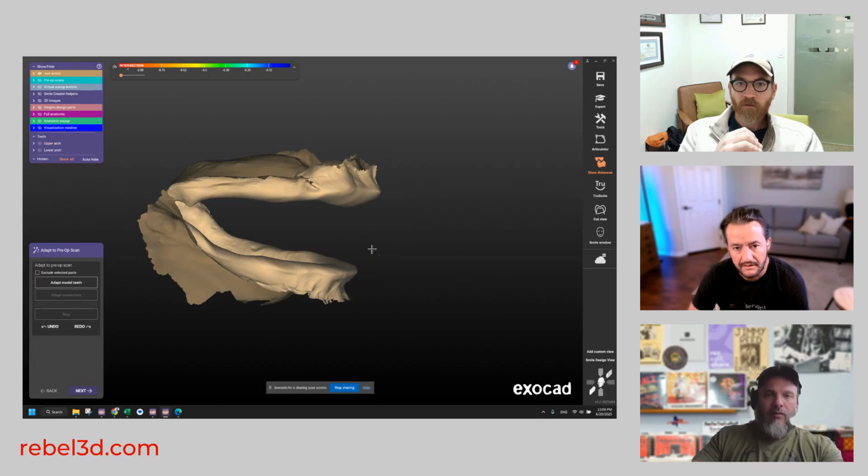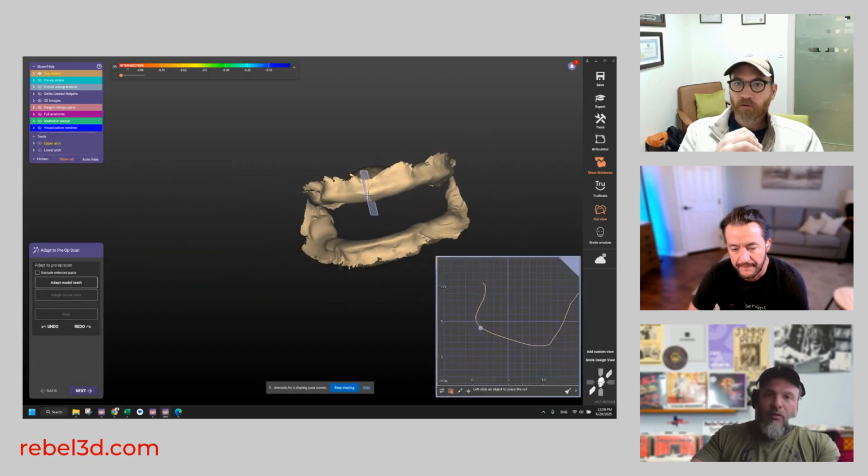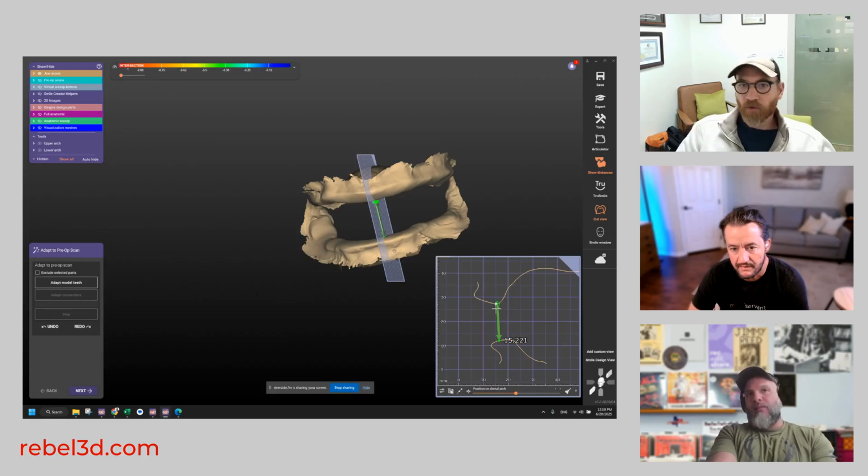Now, the rule of thumb in this type of situation is that I'm trying to get about 30 millimeters of prosthetic space, because each arch should be about 15 millimeters thickness for full contour zirconia. Right now, this is not enough space to create a structure that I'll be comfortable saying is going to last a long time, because at best, I'm going to get about 7.5 millimeters out of each arch.